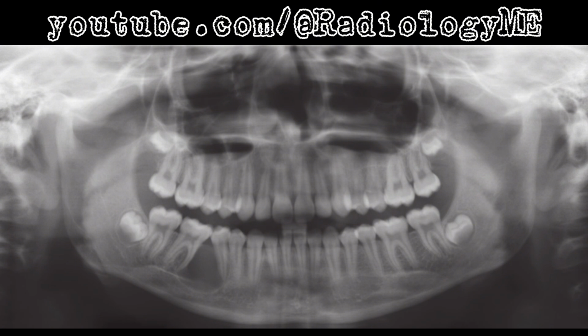The narrow zone of transition between the lesion and the surrounding bone, along with a thin sclerotic rim inferiorly, makes me think this lesion is benign, slow-growing, and relatively well-contained. There's no evidence of cortical breakthrough or aggressive bone destruction, which further supports this.